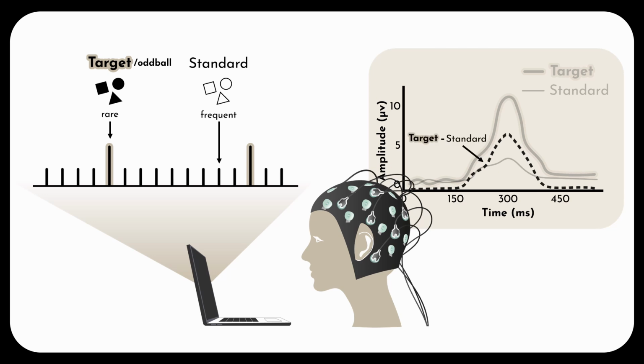If this description sounds kind of fuzzy, well, that's because it is, on purpose. There really isn't a strict set of rules that define some kind of gold standard for the oddball paradigm. It's actually best thought of as a family of tasks that can be presented in different modalities with completely different kinds of instructions depending on your specific experimental needs.